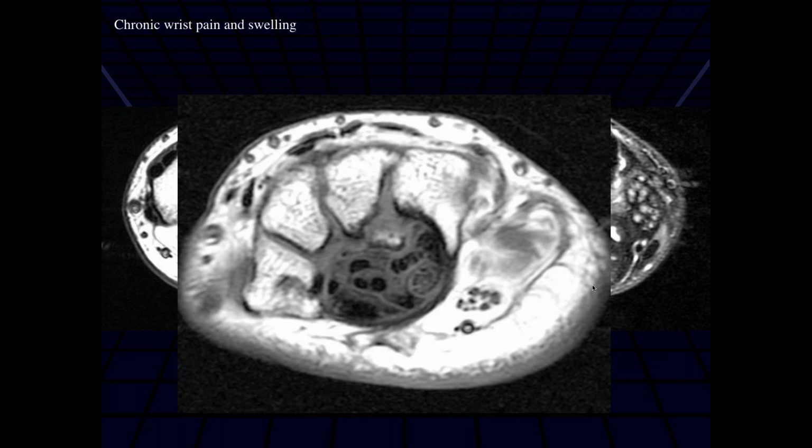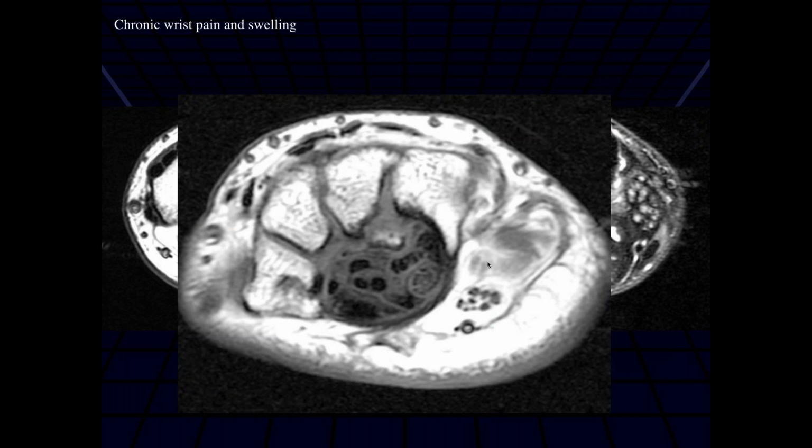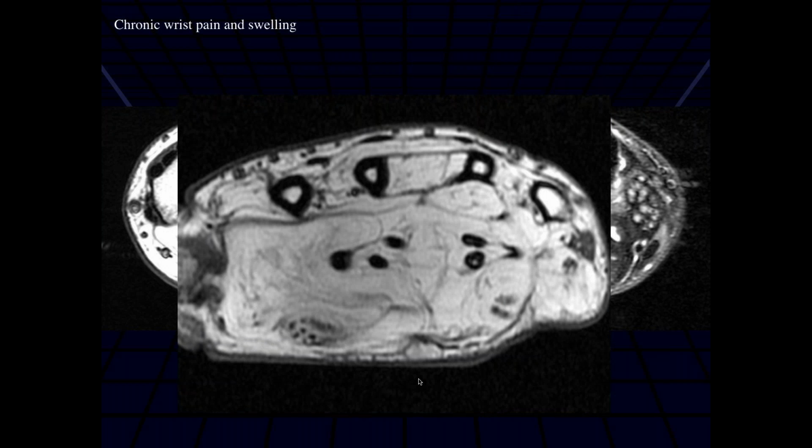And a slightly more distal axial image. Again, I'm concerned for the area lateral to where the flexor tendons are. So this is the lesion, and this is proximal to the carpal tunnel. If you go to the carpal tunnel, it goes down into this lesion. And this is the hand. I see that lesion extending really distally to involve even the hand.